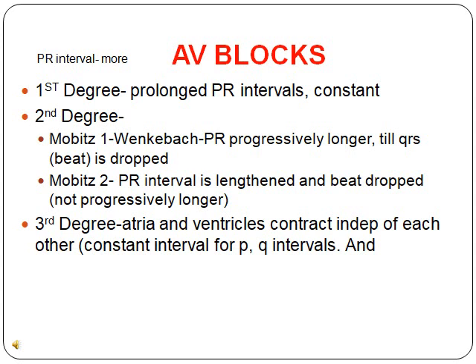A regular PR interval should be less than 5 little boxes, between 0.12 to 0.20 seconds. With AV blocks, you're going to have a prolonged PR interval, more than 5 small boxes or more than 0.20 seconds. There are different types. First I'm going to tell you about them, and in the next slide we're going to show you about them with the little poem.